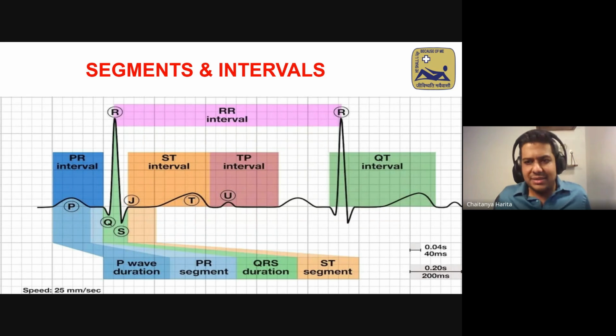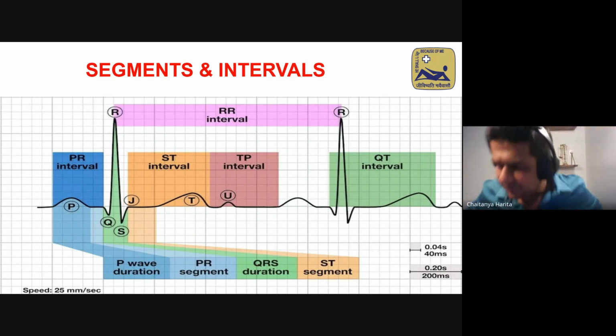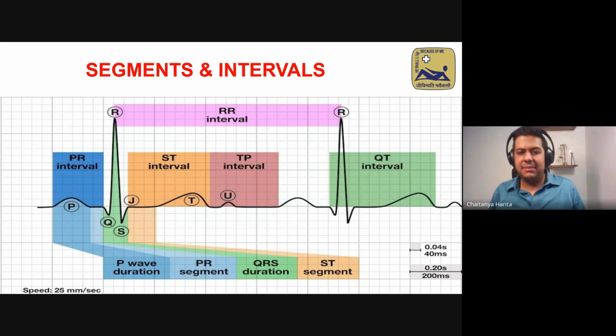Last part of today's class, segments and intervals. And again, something that I find is very much overlooked by a lot of students, because you look at the ST segment, it's not ST elevation MI. I don't need to refer the patient. I can give symptomatic treatment and stop. No.